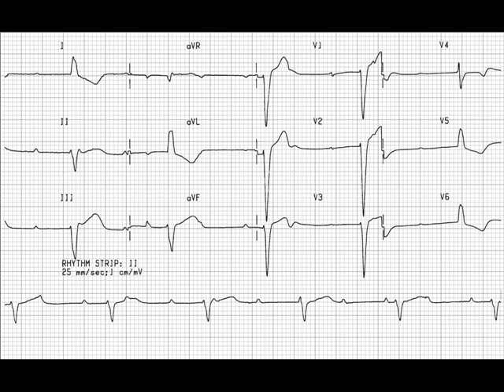So wherever you have questionable association between P wave and QRS complex, do print off a long rhythm strip, maybe 2 to 3 times the length of the 12 lead, so that you can really see whether there is or isn't an association between P waves and QRS complex.